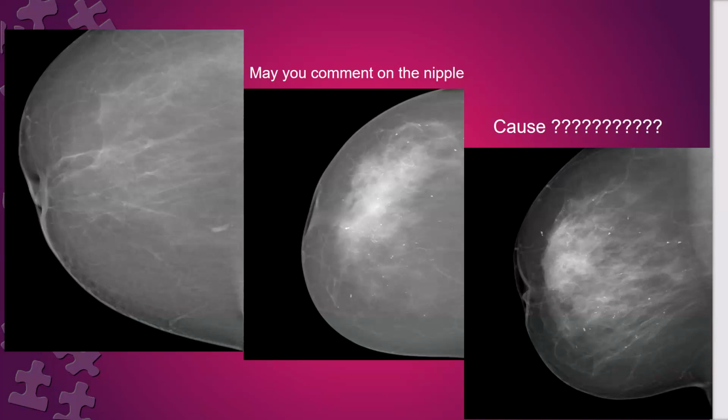Every day we see this nipple retraction. There is a small asymmetric mass with microcalcification. What do you think? Malignancy. Your expectation is malignancy. Any other opinion?